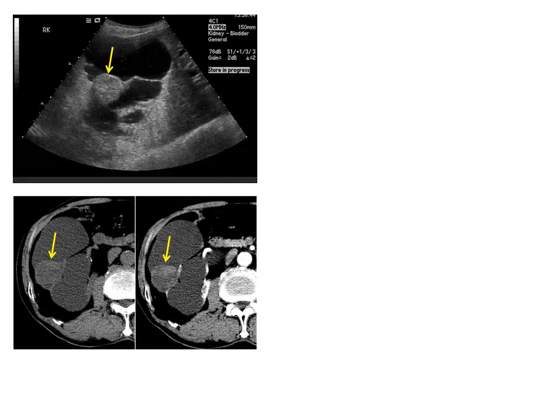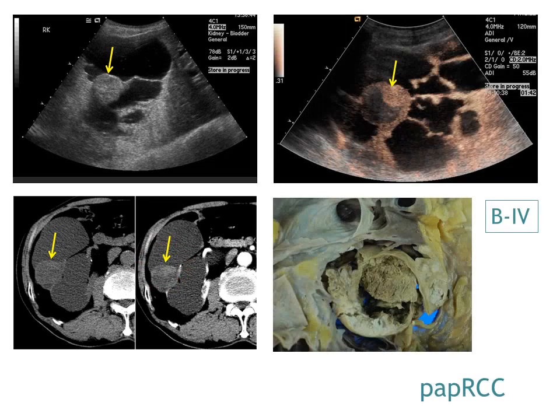Contrast-enhanced ultrasound is helpful when the enhancement is equivocal at contrast-enhanced CT. Here is a mass in the severely hydronephrotic kidney. There are areas of suspicious enhancement at CT. Contrast-enhanced ultrasound clearly shows nodular enhancement of this area, so it is a Bosniak Class 4 cyst and was a renal cell carcinoma of papillary type.